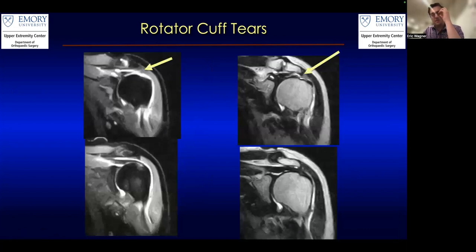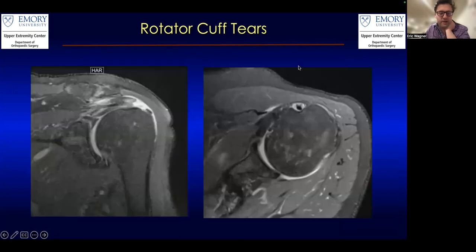And sort of more examples of even bigger rotator cuff tears that are torn and retracted back, and torn and retracted back. And once again, another full thickness example. So the rotator cuff is coming in here, kind of stops there, and you can see there's just a bare tuberosity here. But you can see that the lower infraspinatus and the subscapularis look pretty good.